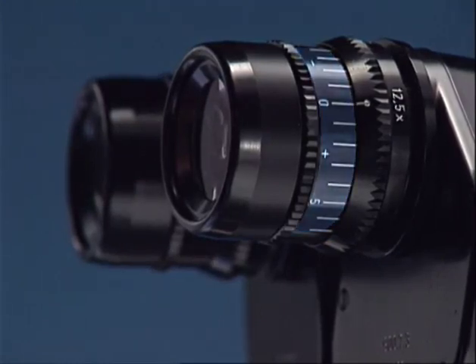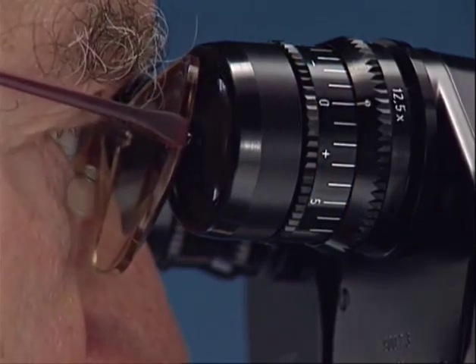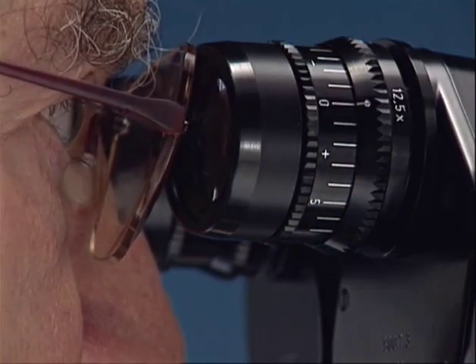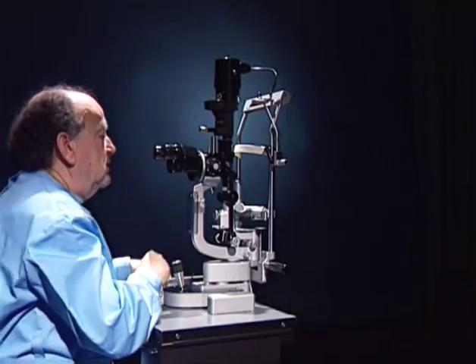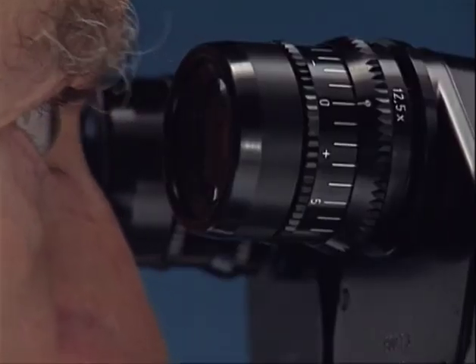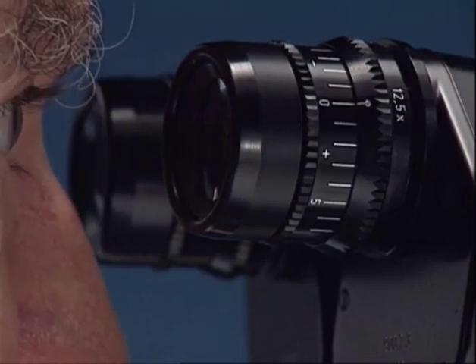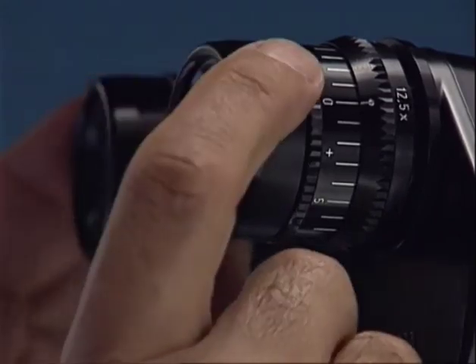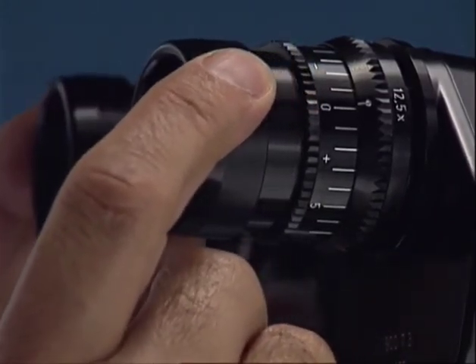The eyepieces are designed for the observer's eye to be at a certain distance from the front lens, that is, the distance suitable for those wearing glasses. The examiner without glasses has to stay at this distance from the front lens and should not approach closer. To ensure the right distance is maintained, the eyepieces are provided with sliding eye guards. These can be extended to keep the observer without glasses at the right distance.